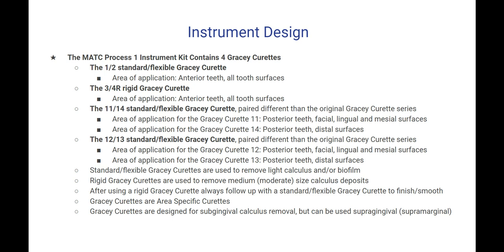Standard or flexible Gracey curettes are used to remove light calculus and/or biofilm. Rigid Gracey curettes are used to remove medium or moderate size deposits. There will be an R stamped on the handle of the Gracey curette if it is a rigid.